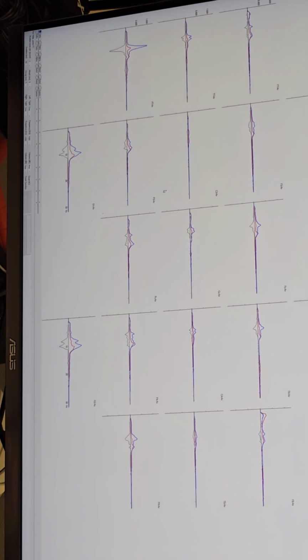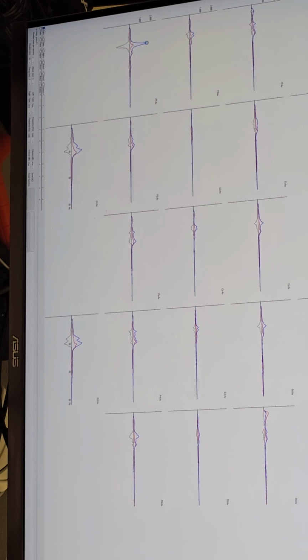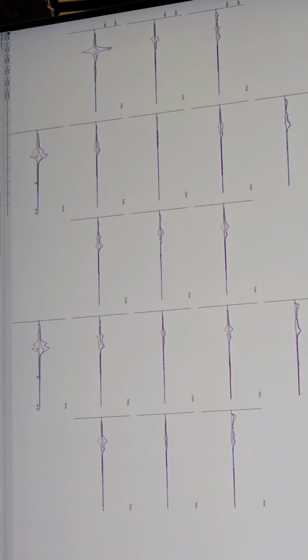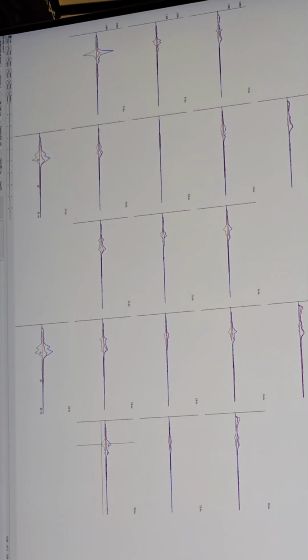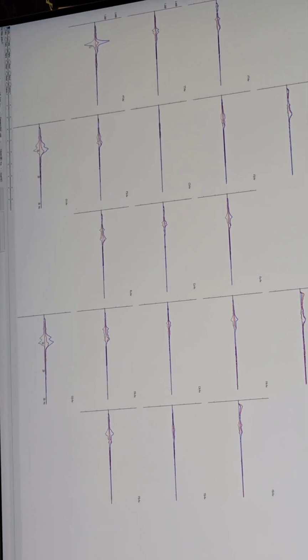Another thing that's different is this temporal slowing, which, remember, look how that blue before is. It's telling me the difference. That's 1.6 microvolts compared to point something over here. Way out of balance. And it looks like that has come down significantly.